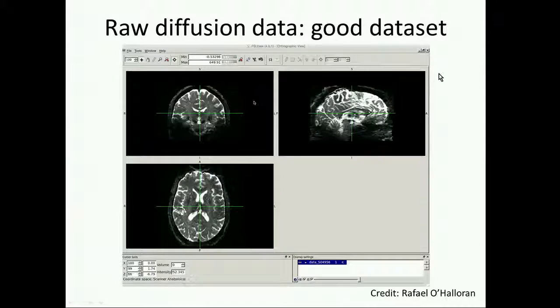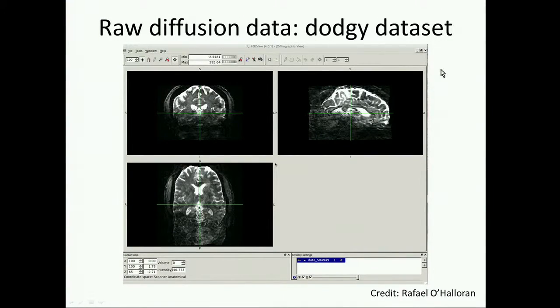And so I think you'll probably be able to see from this next example that this diffusion data set is not perfect. You can even see that from the first volume, from the first no diffusion weighted volume here. There's definitely something going on here, and it's actually present in every single volume, but in this case you don't even need to do that. The number of people who might get a few steps down the road before they see that is quite high.